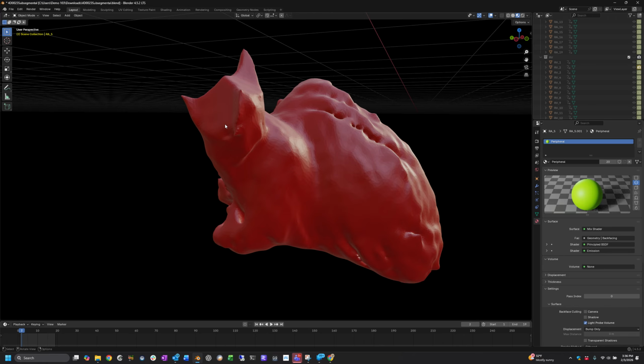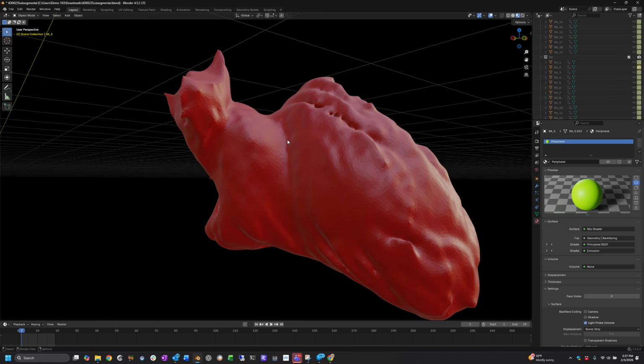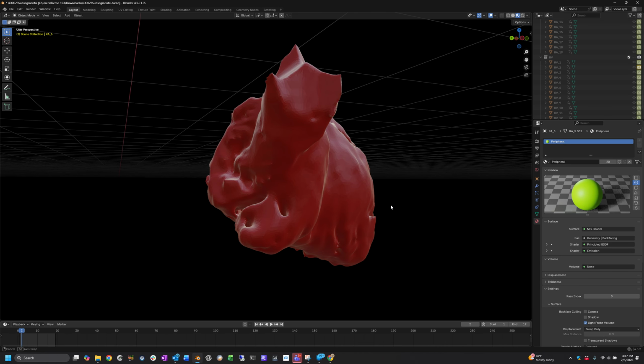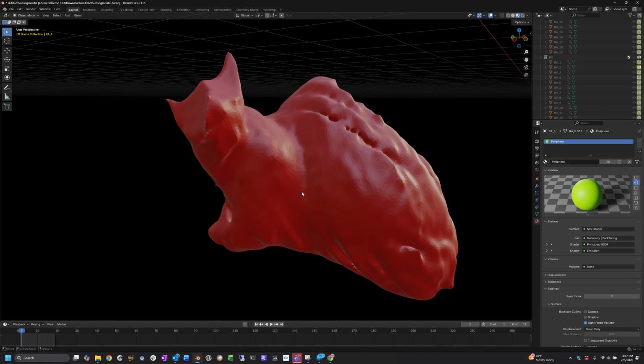If we find that this part up here is too jagged and it's jumping too much in the process, which it may not, but it may, then for the purposes of this first trial, I would not be opposed to finding the smallest angle and just doing a straight cut on all of them at the same spot for the purposes of this specific project, the mesh matching project.